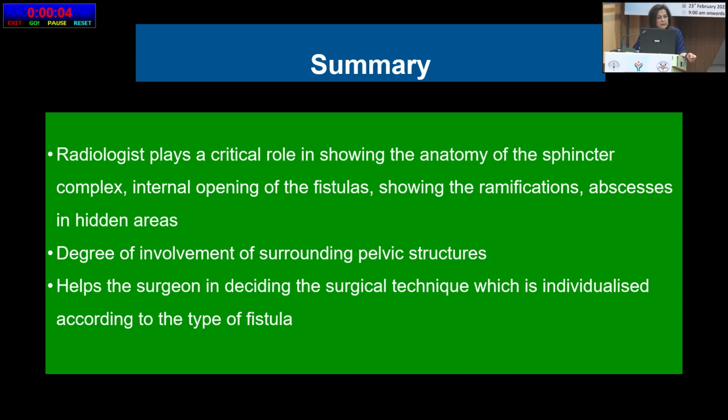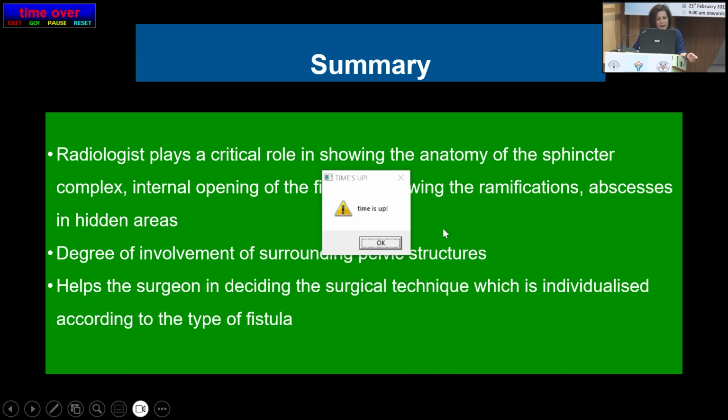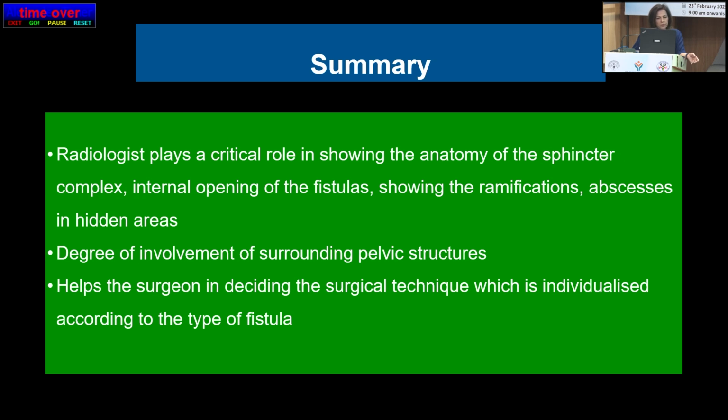So to summarize, radiologists play a critical role in showing the anatomy of the sphincter complex. The internal opening is excellently seen, the ramification, the abscesses, all the hidden areas which you can't see clinically are shown on MR. The degree of involvement of the surrounding pelvic structures is seen very well, and it helps the surgeon in deciding the surgical technique, which is individualized according to the type of the fistula.